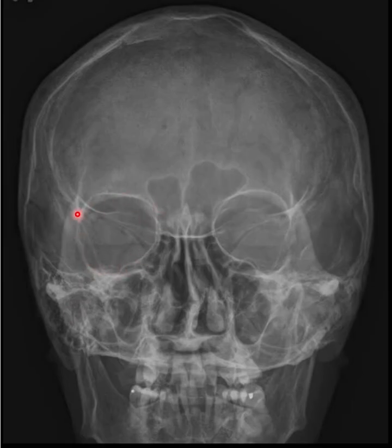And what we can do is measure from the lateral borders of the orbits to the lateral border of the skull. And we want it to be equidistant on both the right and left orbits. In this one, you can see that there's more distance if we measured it from the lateral border of the left orbit to the left lateral border of the skull than there is here on the right.